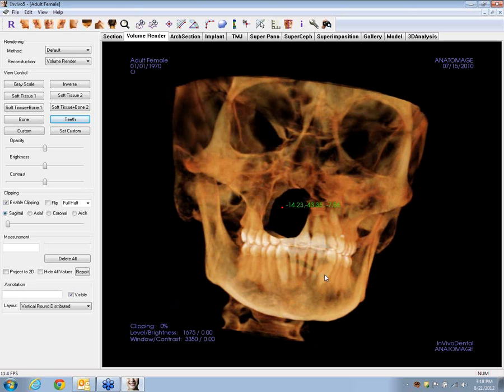So that's a pretty useful tool for keeping track of positions in space. Like any measurement, all we need to do is highlight that thing. It'll turn red, and we can move it, or we can edit it, or we can delete it as soon as it turns red.